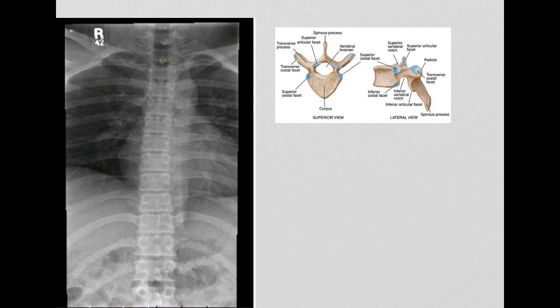All right, so those were our vertebral bodies. Now let's talk about some of the other characteristics that our thoracic spine have. Thoracic spine have this nice long spinous process, and you can see that guy right here. He's usually going to line up right in the middle. Now he's so long that he'll superimpose the vertebrae lying underneath it. We'll also notice that there's this cute little thing we can use to help identify structures on thoracic vertebrae, and this is the thoracic owl.